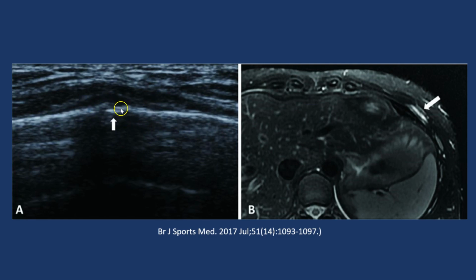So we can see nicely this cortical offset that we might not appreciate in the region of rib fracture on MRI. What MRI does show us that ultrasound does not is all this bright stuff. So all this bright stuff here is edema within the bone. Now we cannot see inside the bone marrow on ultrasound. It's a blind spot, so it's important to appreciate that.